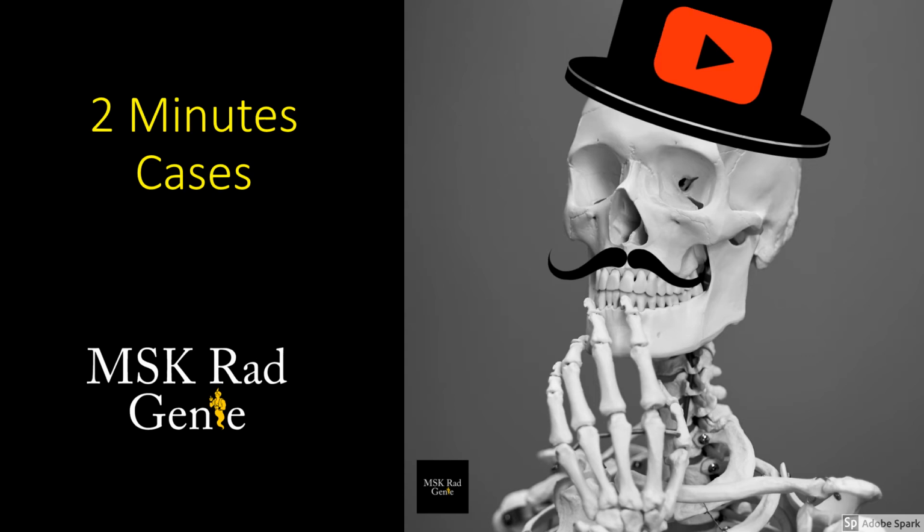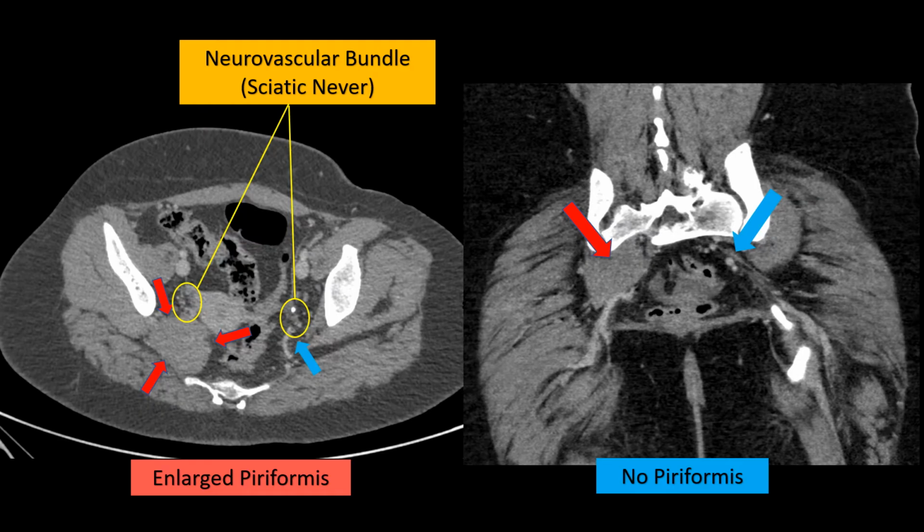Here we go, 2-minute case of the day. So here we have a CT, an axial and coronal, in a patient that was done for abdominal pain, and the radiologist saw this asymmetric soft tissue prominence at the level of the pelvis, just adjacent to the uterus here and adjacent to the rectum, and obviously it's an asymmetric finding that we can see in both images.